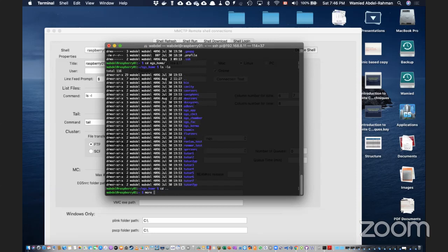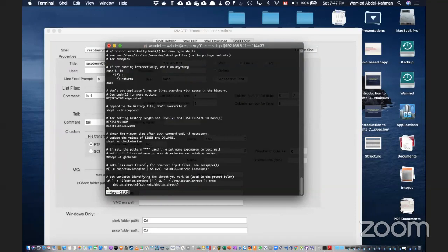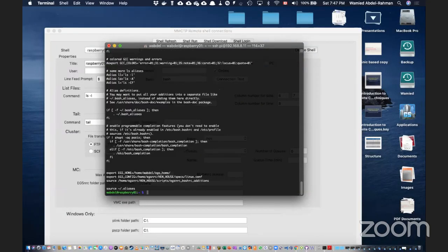And this is in the bash. This is maybe a bit advanced for some of you, but I'm defining in my bash system the EGS home directory to be under Abdel's, but I'm getting the henhouse from whatever is there. The reason why I do it that way: suppose a new version of EGS comes out. What do I need to do?